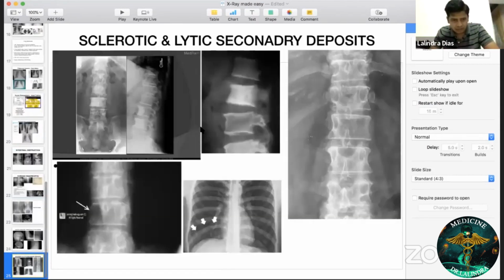The last slide for tonight, and that's the last slide for your X-ray class. Yes, it's a wide coverage of most important X-ray findings. So when you get a cancer somewhere else, like maybe thyroid cancer, maybe breast cancer, maybe a renal cancer, or maybe prostate cancer, I told you earlier, you can get secondaries.